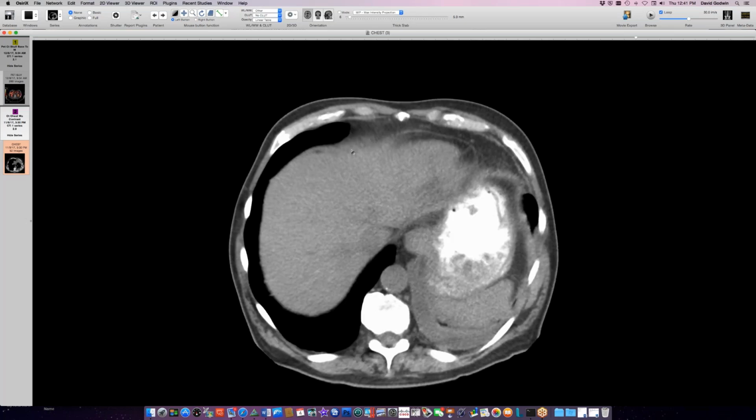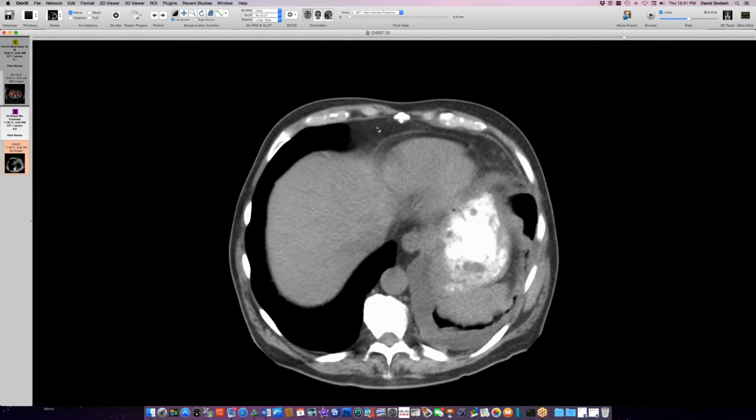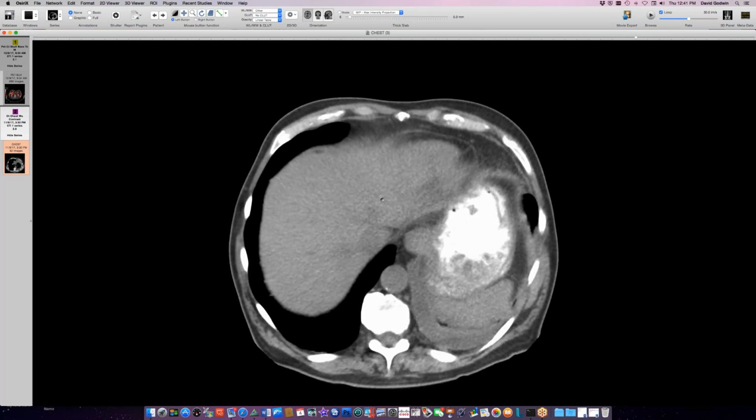For instance, I've seen it go into these diaphragmatic nodes here that are somewhat away from the pleural surface. So I think once it gets into the mediastinal tissue, then it probably spreads up and down via lymphatics and can move around in the mediastinum. And it does sometimes end up in supraclavicular nodes, I read, but I've not seen an example of that myself.